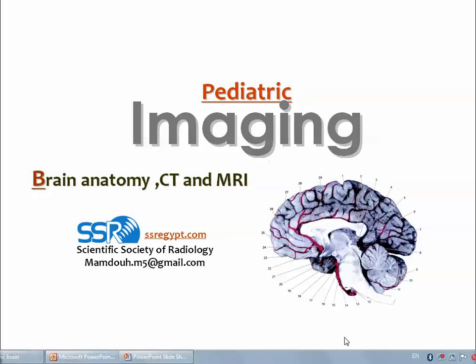Dear colleagues, this is the start of the pediatric imaging series, and we will handle in this domain about 10 lectures concerning some of the neuro imaging and musculoskeletal imaging, spinal imaging, and gastrointestinal imaging as well.